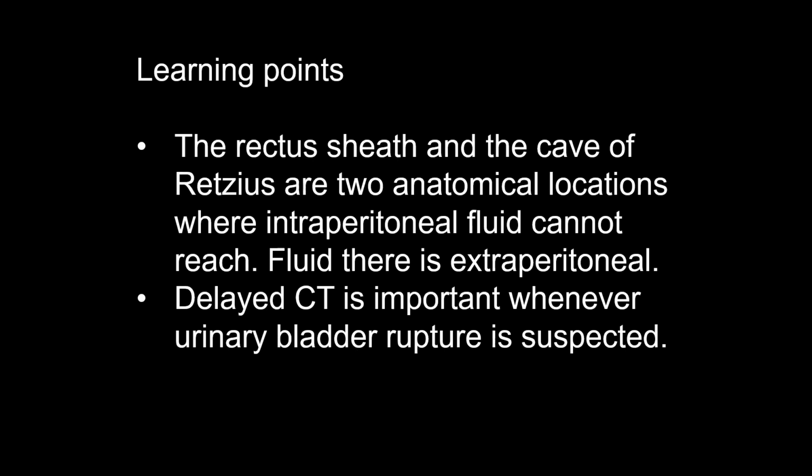And the learning points are the rectus sheath and the cave of Retzius are two anatomical locations where intraperitoneal fluid cannot reach. Fluid there is extraperitoneal. Delayed CT is important whenever urinary bladder rupture is suspected.